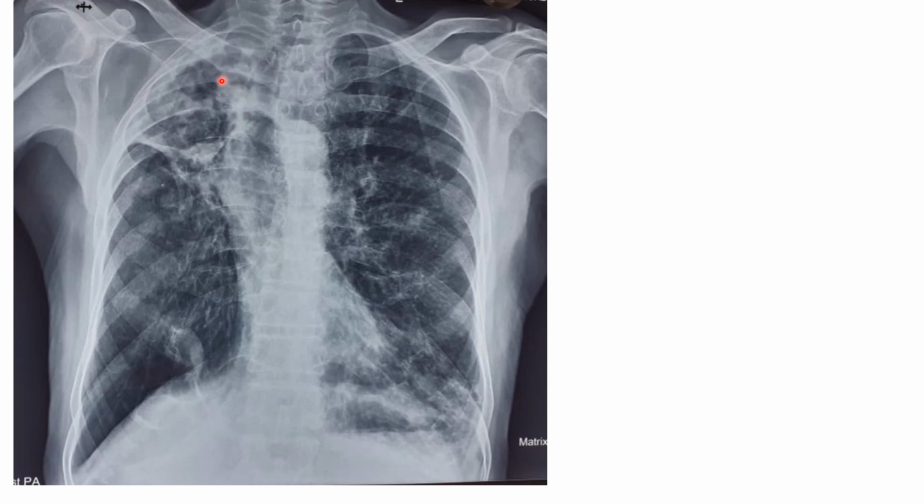And the second thing is the trachea is quite pulled to this right side, right? This is a fibrotic band, and you can see this kind of pulling effect because of the fibrosis. Even this diaphragm is a little bit pulled up because of this fibrosis.